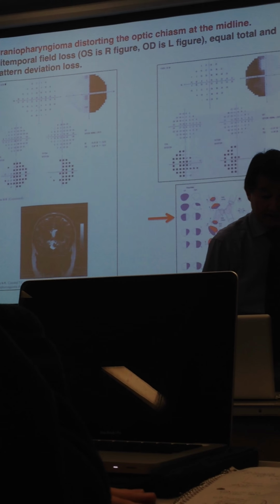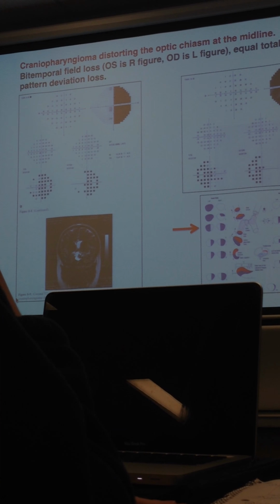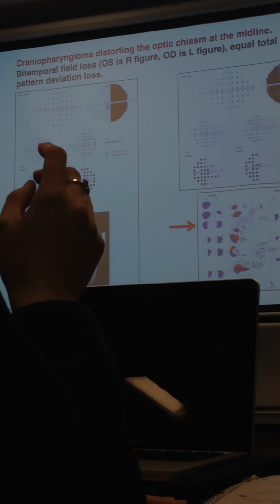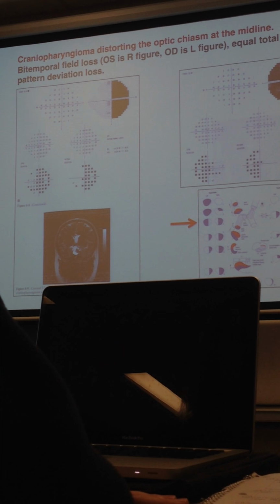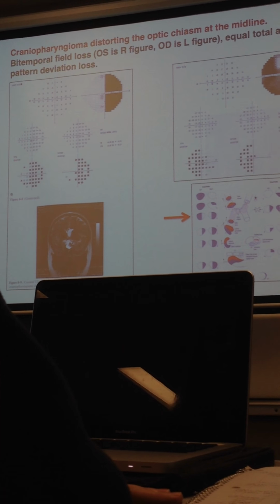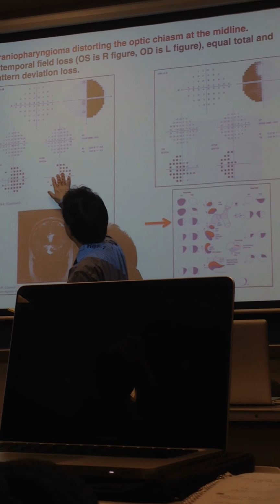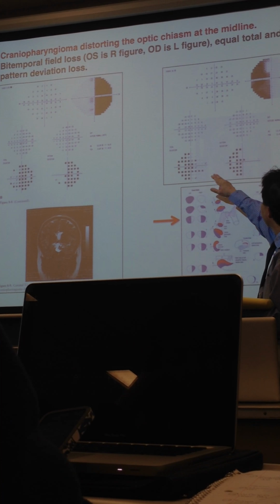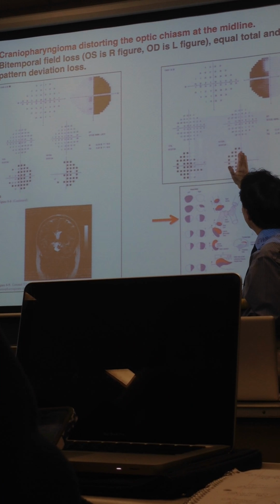So you hear a lot about hemianopsias, quadranopsias, you know, observing the midlines, being very distinct. That's another reason to test confrontations on the midlines rather than just in the quadrants, because these aren't congruous. But here again, you know, there's a slight change here. There might have been a little bit of general loss, but for the most part, it's exactly the same, right? Especially away from the midline.